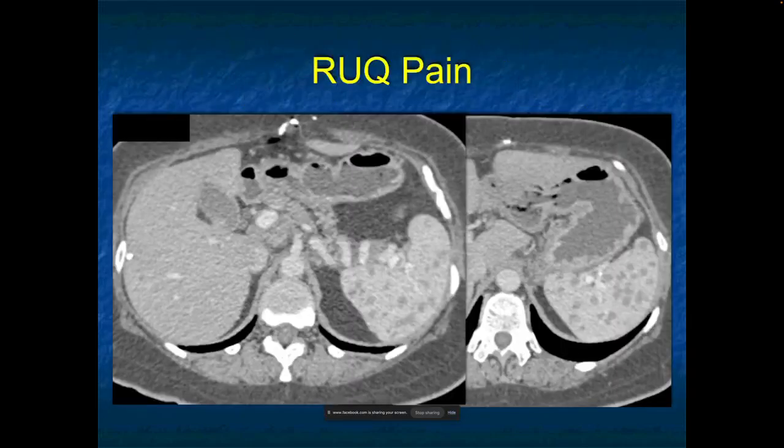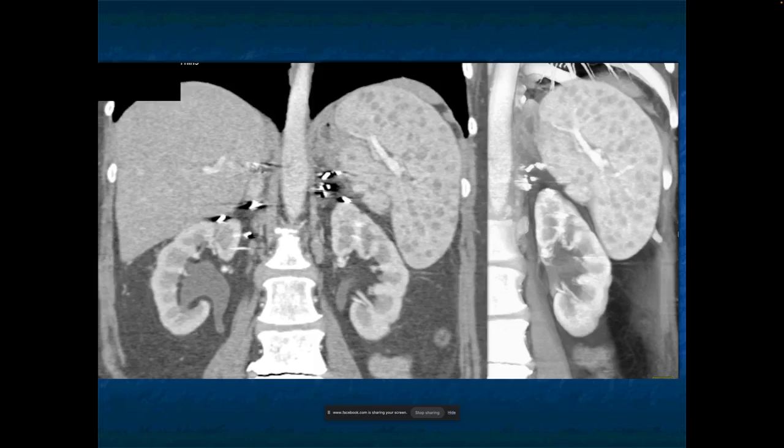Okay. Right upper quadrant pain, right upper quadrant looks good. Multiple splenic lesions, patients immunosuppressed and febrile, candidiasis, aspergillosis. Doesn't look like cysts, it looks like numerous lesions. One of the things we know, and I've shown you a number of cases before, is that sarcoidosis can give numerous lesions in the spleen, and can also occur in the liver at the same time. Obviously, you worry about small cysts, small hemangiomas, but it really doesn't look like it. These look like solid, small masses.